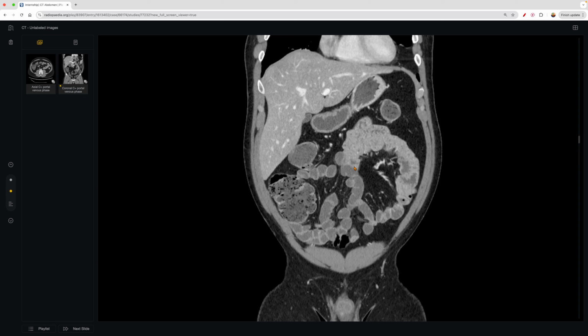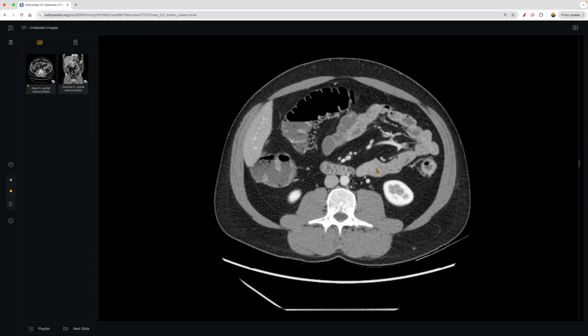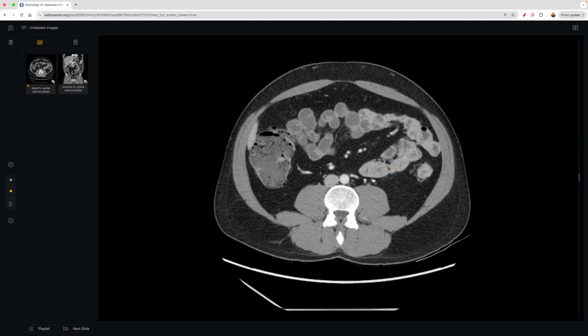Normally, you'll be able to see anything that stands out and is striking, and then you can see the kidneys as well. Now, I think one big important note here is that a lot of times it's easy to skip looking at certain views. Typically in a hospital setting, clinicians and other healthcare professionals mainly focus on the axial image. The axial image certainly provides a lot of value, but with any type of viewpoint, it has its own limitations.